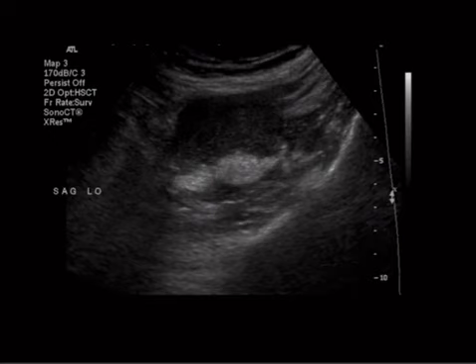All right, so what about this one? That thing. Ultrasound, I'll tell you this is an ovary. And there's a big hyperechoic plug. It's a buzzword.